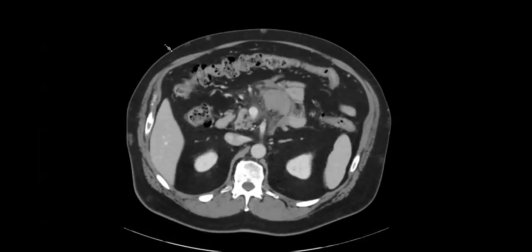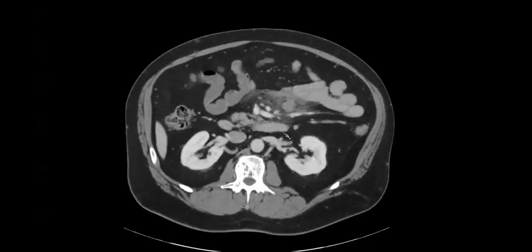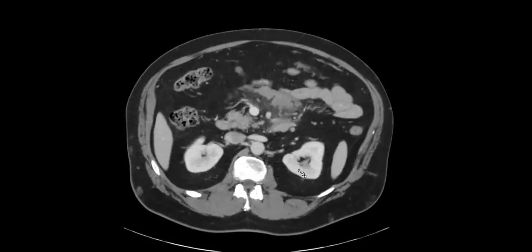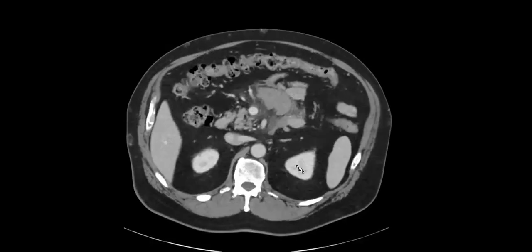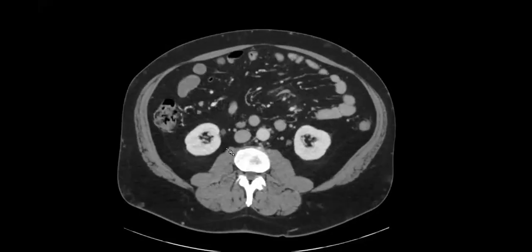Excellent. So when we think about mesenteric masses, our differential definitely includes, is this a mass? Is this mass lymphoma? Sclerosing mesenteritis usually looks more sclerosing, like fibrotic tissue, maybe even with dystrophic calcifications. This one also has a lot of stranding around it. So you could also think about a carcinoid met, a neuroendocrine met, but that usually doesn't look this big and blobby. And it's not usually jejunal. It's usually from the ileum, so it's usually down in the right lower quadrant.